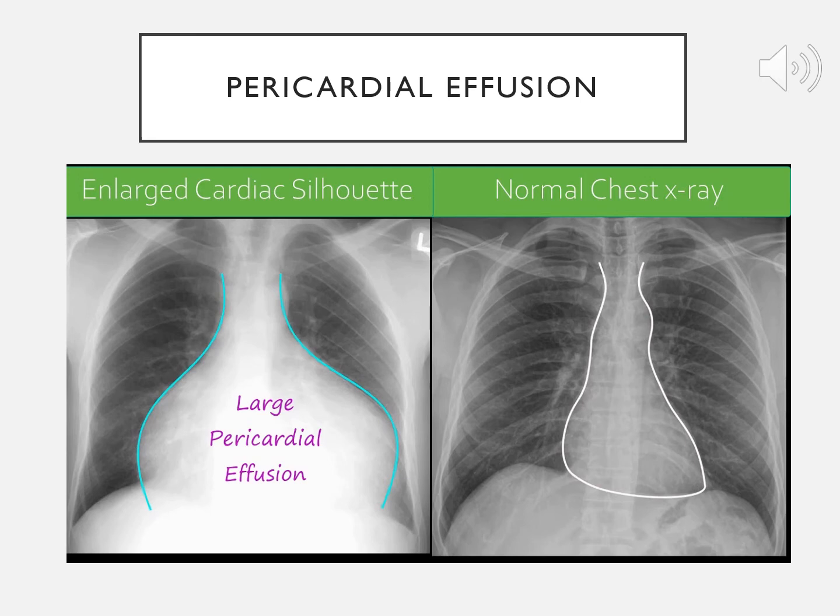They don't always look like this, but this is a pericardial effusion, fluid in the pericardial space. You can look at the image on the right. Again, look at the image on the right. Is it centered? Is it a PA? Can you identify all the structures that you need to identify? You look at the size of the heart, cardiothoracic ratio versus the one on the left. Just by guessing, you can tell that the image on the right could definitely fit inside the right lung, and the image on the left could not.